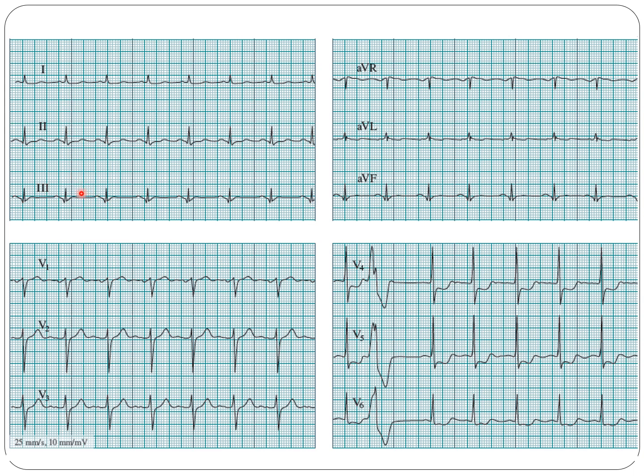Next, we have to look at the QRS complex. Do we see any pathological Q wave in the QRS complex? By looking through the limb leads, I cannot see anything. In the chest leads, V1, V2, V3, V4, V5, no, we don't see any. And if you look at V1, V2, V3, the R progression is normal, so there is no R regression or any other changes. Here we do see in V4, V5, V6 an early coming beat, and that QRS is wider than the previous one and has negative ST-T changes. So this is coming from the ventricle. So this is a ventricular premature beat.